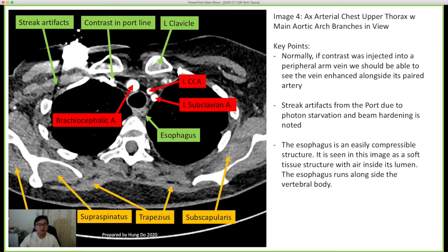But our esophagus, because it's just food, and with gravity food falls, and along with the peristalsis movement, it doesn't need to be open all the time. So don't be tricked by some radiographers asking you if this is the esophagus. It is not the esophagus. It's too large to be the esophagus.